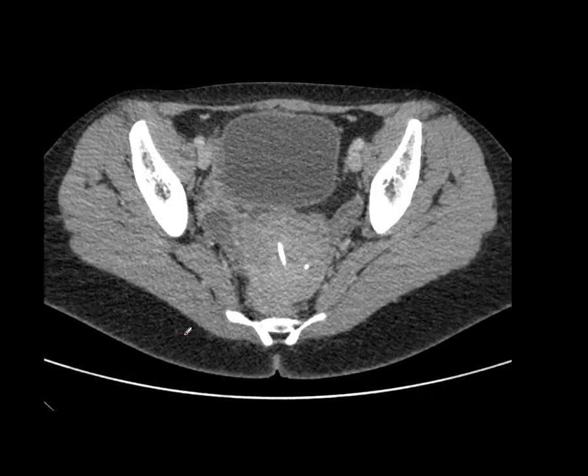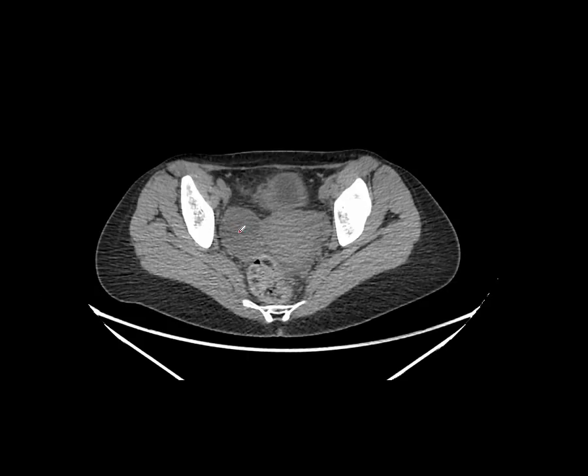Follicular cysts and follicles can grow very rapidly. Here's a patient who is being staged for lymphoma. She had an initial CT scan when she came in, demonstrating a small cyst here, or small follicle should I say, which I think was about 16-17 millimeters, I'm not quite sure. 6 days later the patient had a PET scan for full staging of the lymphoma, and it demonstrated a marked increase in size of the follicle into what we would assume to be a follicular cyst.